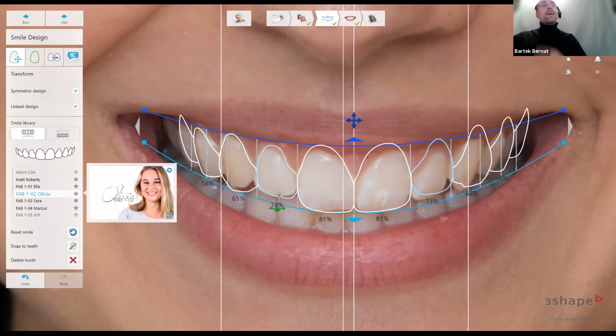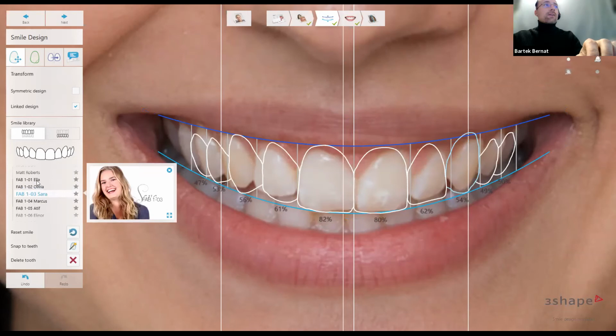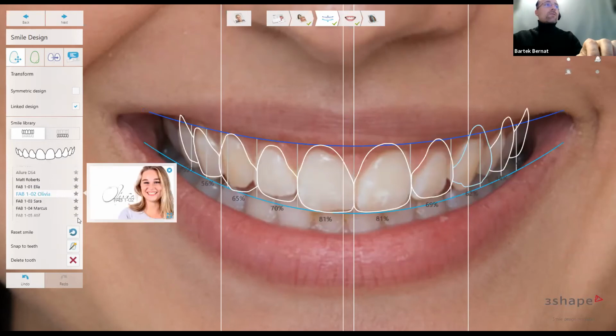You can see here, maybe the picture is not that symmetrical, so you can disable that and do this one alone, and do this a bit more. So basically, as you can see, you can have different layouts. This is one of the choices. There's plenty of choices here. I just chose that one. There's also Sarah or Ella, lots of them, but let's just stay with this one.